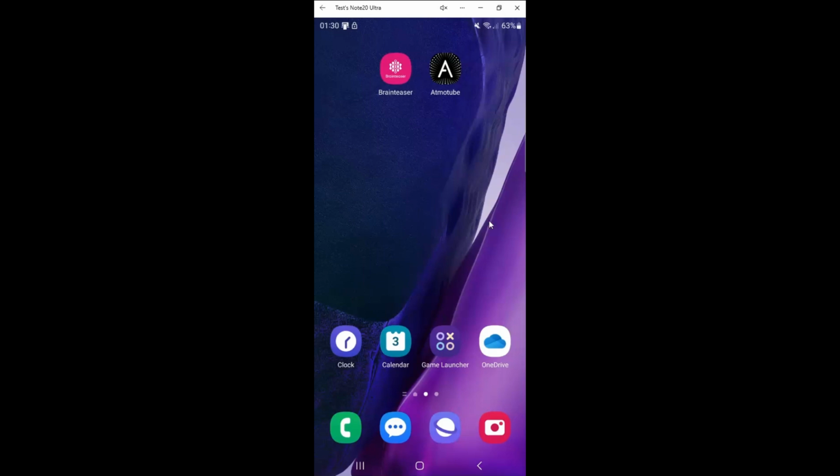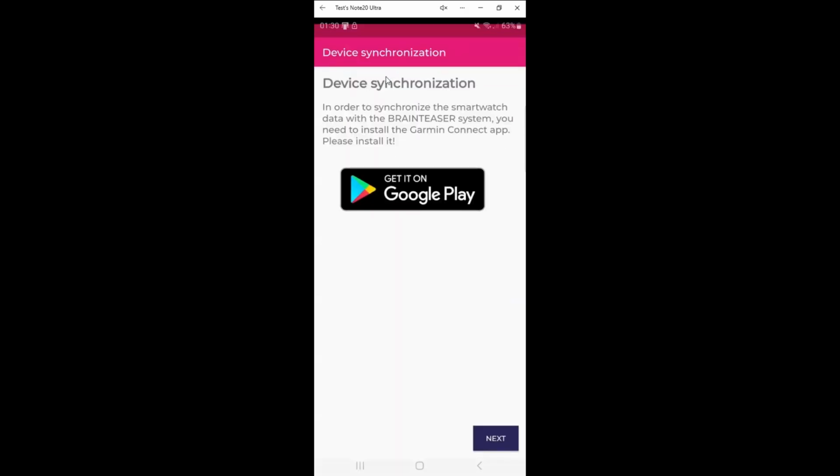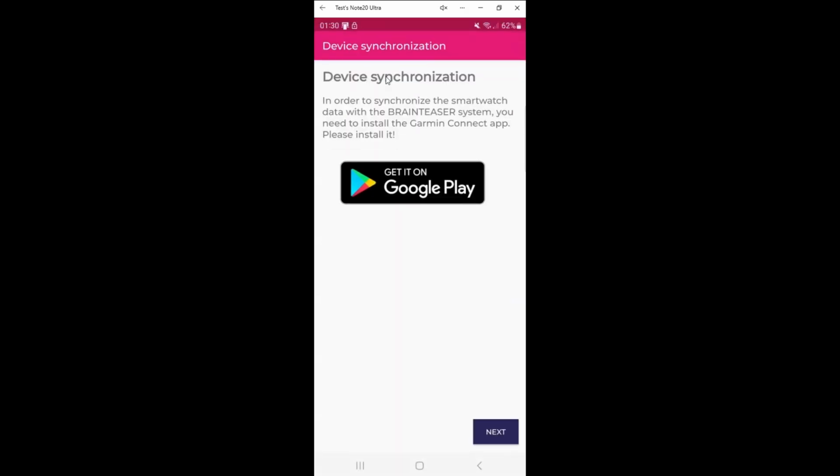During this period, to minimize potential data loss, a verification mechanism was implemented. Each time the patient opens the app, it checks if the Bluetooth connection is turned on. Then the patient must use the credentials provided to them, i.e. the access code received by email and the password created using the link contained in the same email. As the initial configuration is the same as in previous periods, we will skip it, and when we log in we will be taken directly to the initial screen.